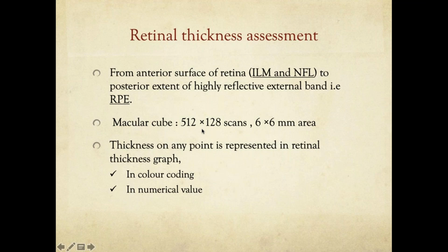That will give you a clue of whether, even if the vision is good, even if the central foveal thickness has returned to normal, the eye needs further injections or other treatments, or whether the patient needs to be explained the prognosis that although the central fovea is normal, the area around the macula has been damaged and is slowly shrinking. So these are the things that you must not forget to analyze and tell your patients, because I think most of you just look into the central macular thickness, right?